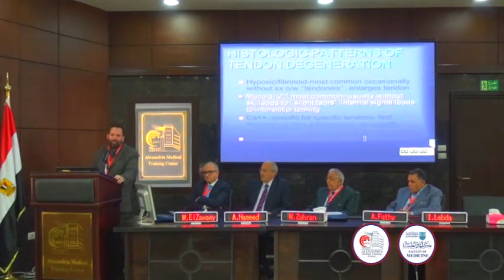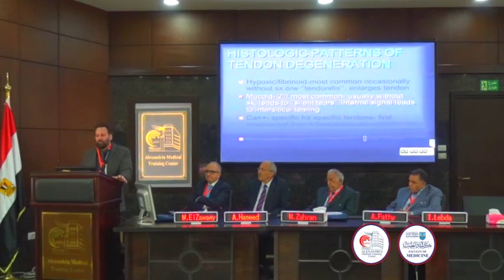Now, hypoxic degeneration gives you an enlarged tendon without internal signal. And we can see the reactive edema here, but that is no less abnormal than a tendon with abnormal signal. In fact, it probably is more abnormal than a tendon with normal signal. Some people call that fibrinoid degeneration, but most people call it hypoxic degeneration. And you see that in a black enlarged tendon. The second most common degeneration is mucoid. And mucoid is vacuoles within a tendon.